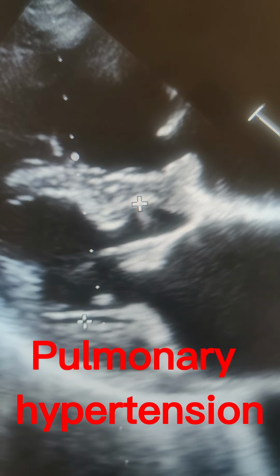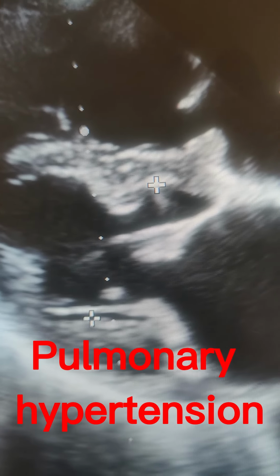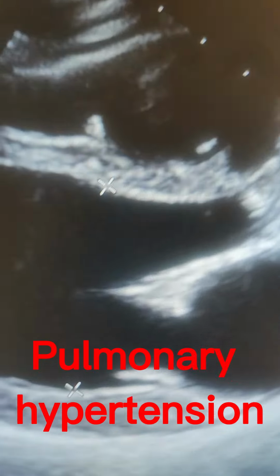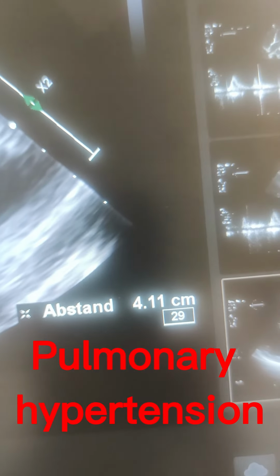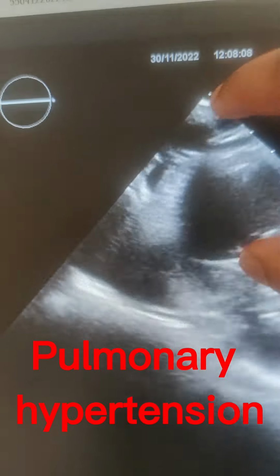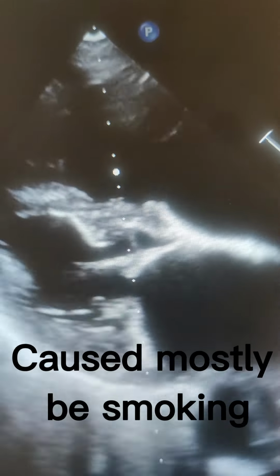Due to the distension of the right ventricle, the left ventricle is being compressed. The left ventricle that is supposed to be 56 millimeters or 5.6 centimeters is now just 3.4 centimeters, which is affecting the blood supply to all parts of the body. As you can see in our healthy patient, the left ventricle is 4.1 centimeters. And as you can see on this film, the right ventricle is very big, compressing the left ventricle, which is also obvious on this view.